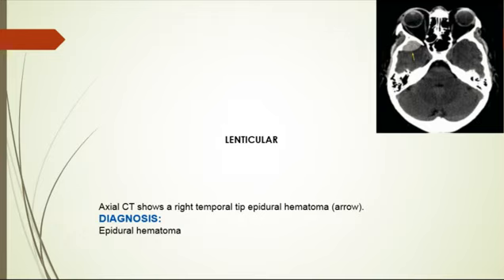Less commonly, dural venous sinuses. Classically, the patient has a lucid interval followed by rapid loss of consciousness due to high pressure bleed beginning to compress intracranial structures. At imaging, the extradural hematoma has a lenticular appearance that is constrained by the cranial sutures. It does not cross the sutures. Prompt surgical intervention is critical for minimizing morbidity and mortality.